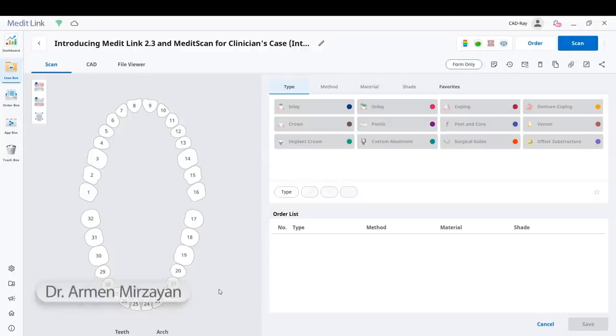In this video, I'm going to try and attempt to cover some of the great advancements for digital dentists on the Medit Link software and the Medit Scan program that was launched in late 2020. It'll take quite a lot of days to document all the neat features and all the powerful tools you have at your disposal, and it's definitely geared towards people who are exposed to digital dentistry, have had some experience, and are looking to get into scanning.